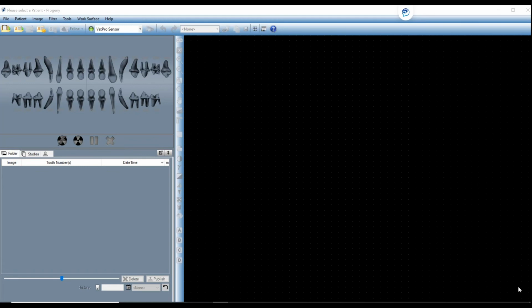Backing up and restoring patient data. Midmark Imaging stores patient data on the computer where Midmark Imaging is installed in a SQL Server database or on another computer on the same network. A backup of the database can be performed to safeguard the data. In the event of data loss, the data can be restored.